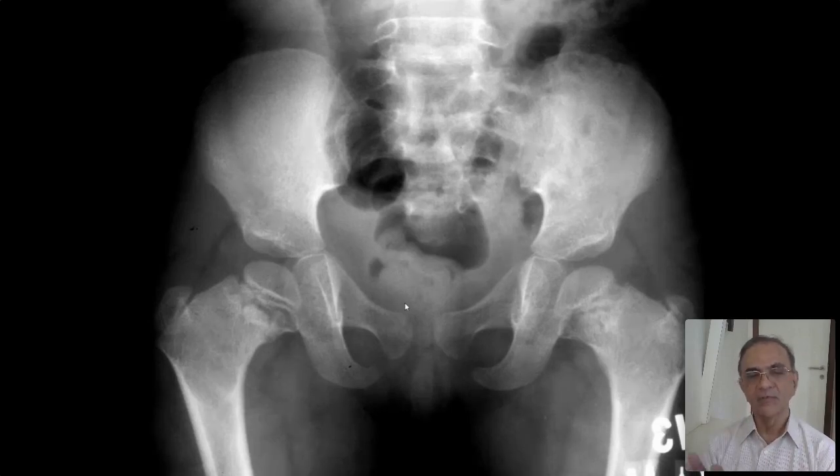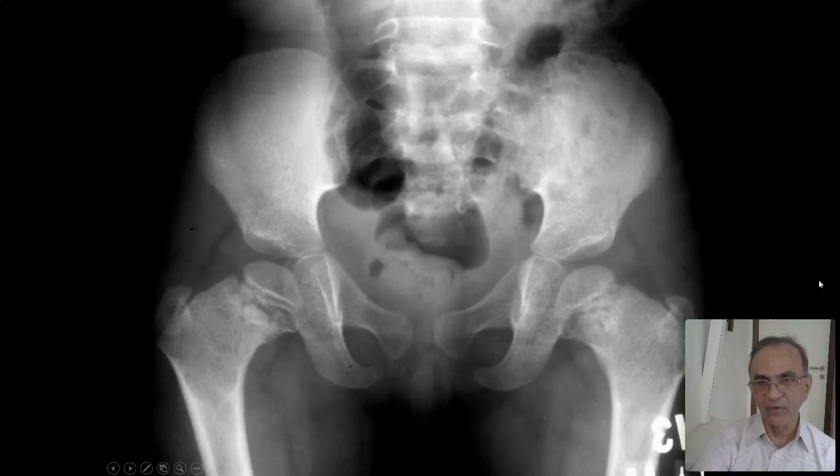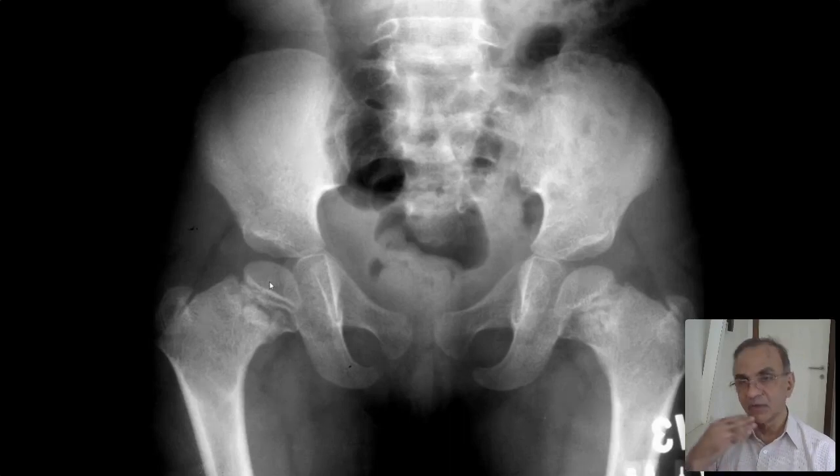But both of these, you may believe me, you may not believe me, show ground glass opacities. The neck of the femur here, the neck of the femur here. So when you have to use the word ground glass opacity for something which is a soft trabecular pattern, it is diagnostic of fibrous dysplasia. No other disease has the word ground glass opacity, whether it's unifocal or whether it's a part of a syndrome.